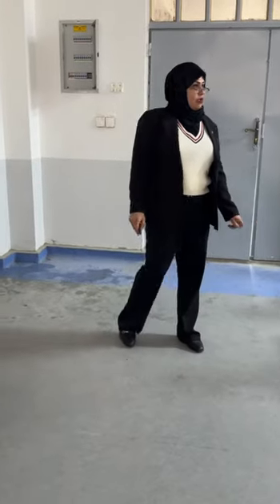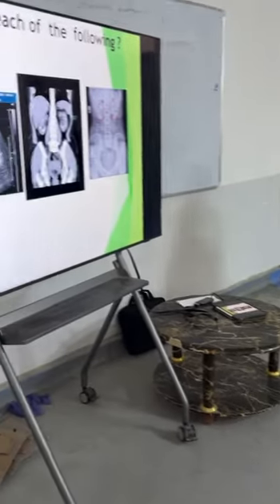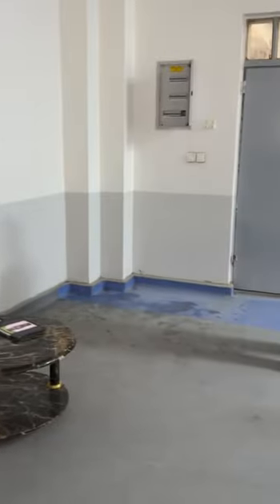The next image. Yes, CT scan, coronal view. It shows multiple hyperdense lesions. First of all, we talk about the size. Both are good in size and well defined, and show multiple bilateral hyperdense lesions.